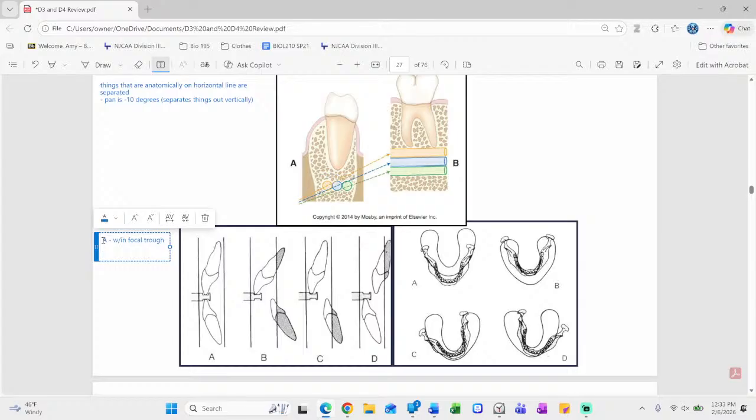But when teeth are tilted, we're a big class 2 here. Class 2 here also, but we caught the upper, and of course a class 3 here on D. We're not going to catch everything. All right, some things may be in and out. Same thing when the jaw is rotated, head is rotated, or we're slightly back or slightly forward.